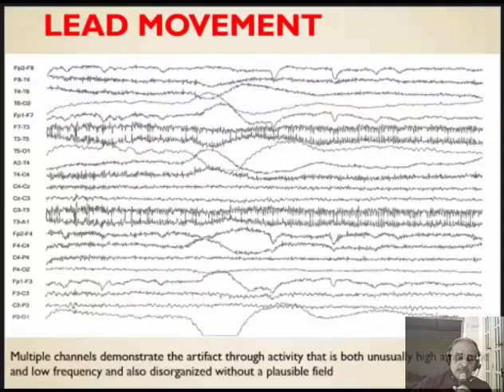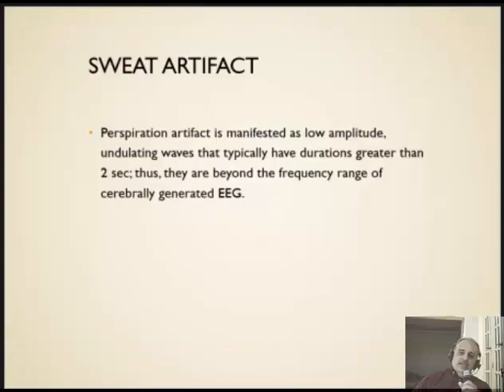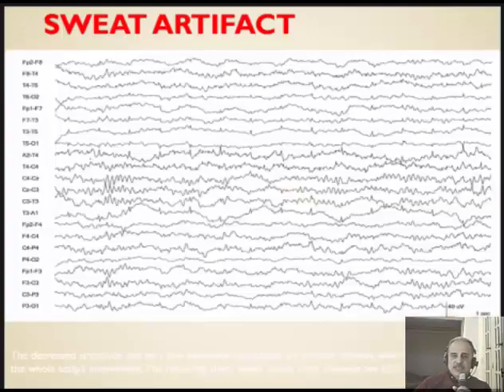In more than one electrode, ionized sodium salt in the sweat can create a field below and around the electrode, giving a special type of artifact called perspiration or sweat artifact. These are of low amplitude and low frequency. Can you see them?